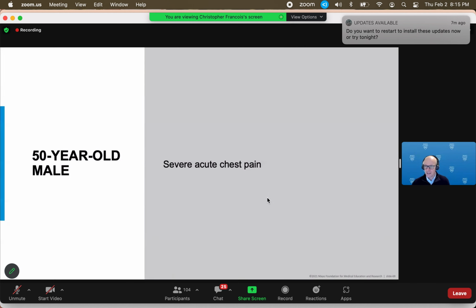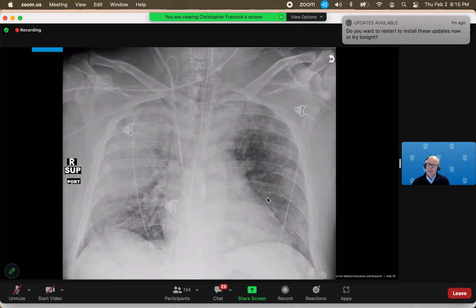And so we have some more cases moving beyond coronary arteries and congenital heart disease. This is a patient who presented with an ST elevation MI, and this chest X-ray shows isolated right upper lobe consolidation. In a patient who just came in with a STEMI, if you see isolated right upper lobe consolidation, this is lung edema, you want to think about a ruptured mitral valve.